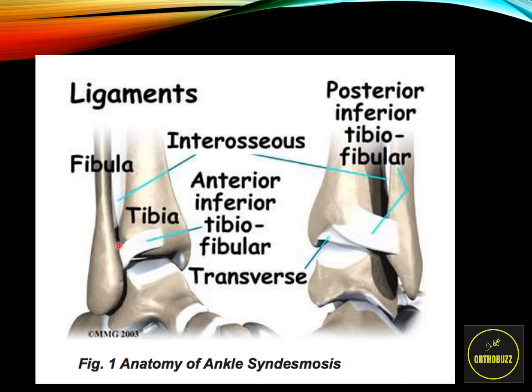And therefore, in all of our ankle x-rays or fractures, we need to assess whether the syndesmosis is stable. A stable or intact syndesmosis means that the ankle is stable. An unstable syndesmosis, or one which is compromised, will mean an unstable ankle, and therefore may need an operation.